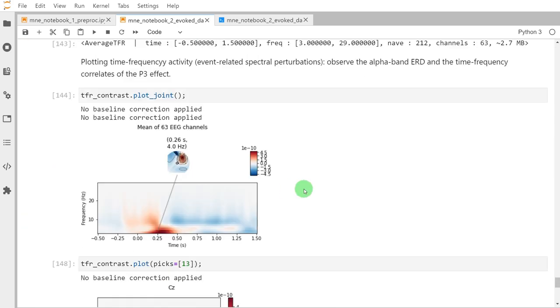We have seen today the different ways we can visualize ERP data using MNE's available methods, and we have also seen the time frequency decomposition. Please study the toolbox yourself and get more hands-on experience. In the coming sessions, we're going to extract those data and then feed them to our classifier.